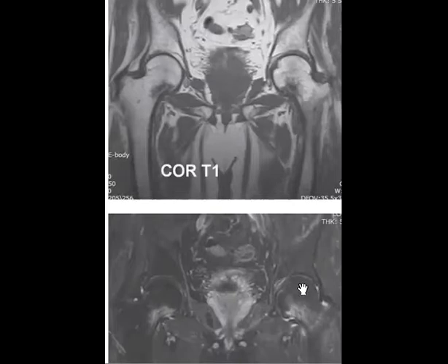Sometimes if it is in the subarticular region, you can put avascular necrosis, but in this case, I don't think you can put it. And you can put osteomyelitis, maybe, but for bilaterality, I think it will be against osteomyelitis. So yeah, Nermine, so why insufficiency fracture?